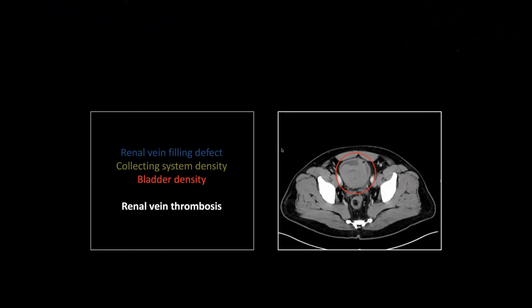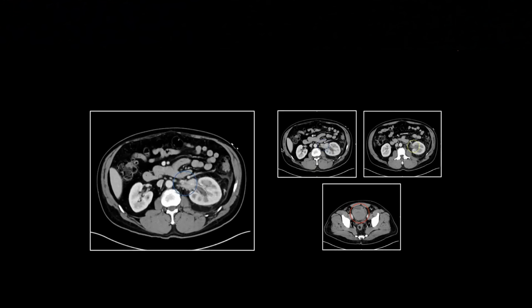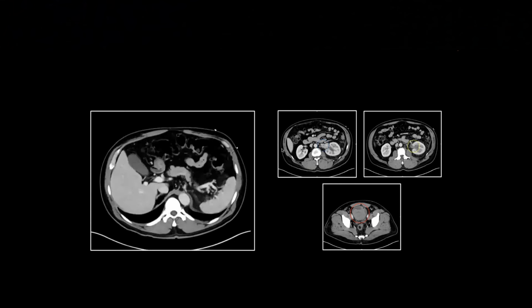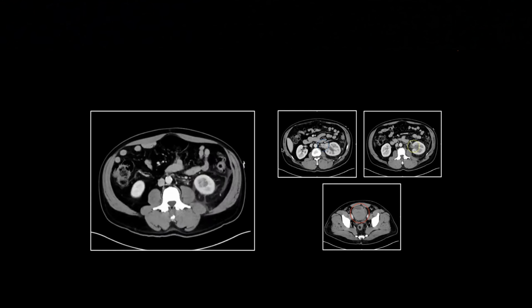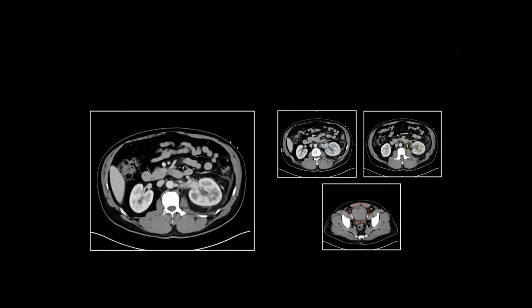So this patient had something that was bleeding in the collecting system, and ultimately clotting in that region extended into the renal vein. Certainly it could have gone the other way. Perhaps the renal vein thrombosed first and then caused something else to bleed and dump into the collecting system. I don't believe that's the case here. The left renal vein is not enlarged. The thrombus in it does not appear occlusive. And so I think that probably this began with hematuria and clot extended, non-occlusive clot extended into the left renal vein.